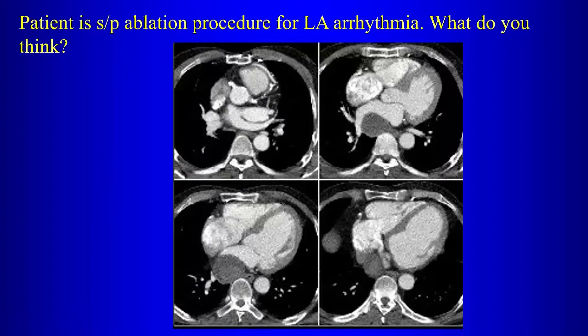for left atrial arrhythmia, what do we think? Anything abnormal? Do we see anything? Well, the first thing is, do you think that's actually in the atrium? Where do you think it is?